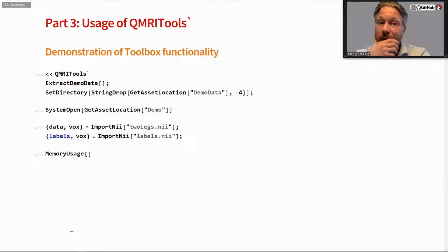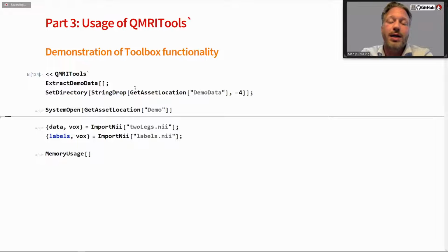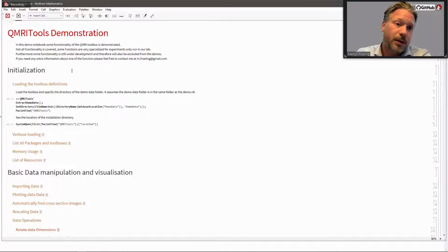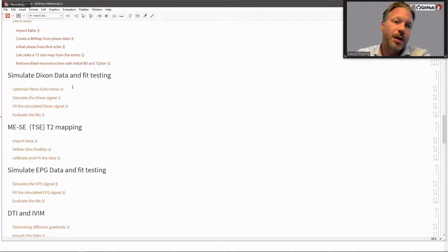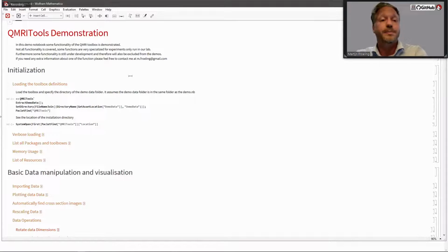In the last few minutes, I want to give you some demonstrations of the toolbox functionality. For that, I'm going to use the demo data. This demo data is also highlighted in this demonstration notebook that's packaged with the toolbox. This is a notebook that demonstrates most functionality within the toolbox. I put it with the tool so people can play around with it.